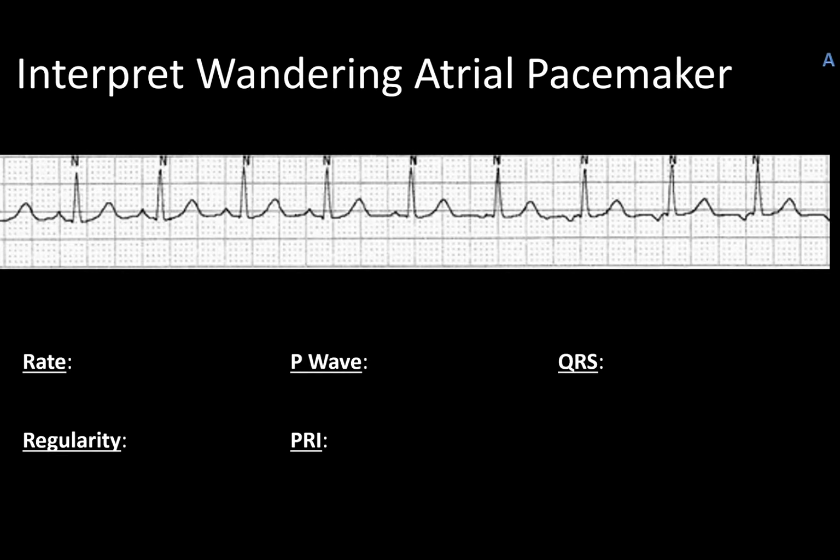Okay, just like we do with all of the others, this is a 6-second strip, and it is in the 2 lead, and we're just going to go ahead and number these because this will come in handy later.